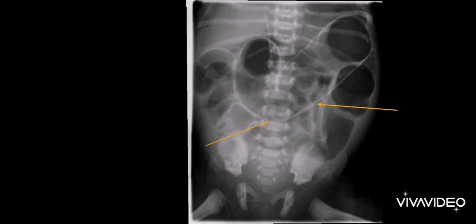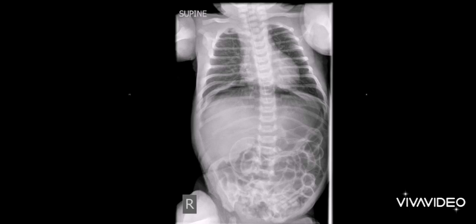So you will see kind of in the earlier abdominal presentation that we can see shapes of the bowel at times. However, this is a thicker white line. So it's where there is gas where it shouldn't be, and it's portrayed like this. Also in this one, you can see that kind of thicker white line in different areas, and this is an abnormal finding, and might be referred to as the Rigler sign. So again, it's free air where it shouldn't be.